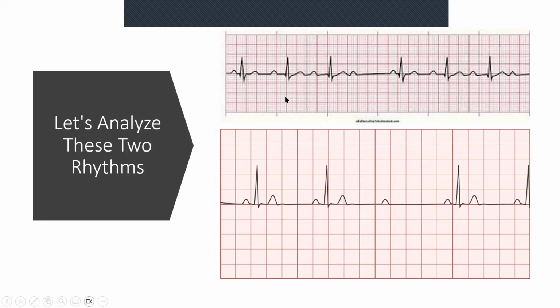If we had to analyze it completely, we've got normal P waves, we've got a PR interval that's getting longer and longer. We have narrow QRS complexes with a missed beat. And then we see the cycle starts again. PR getting longer, and there it's going to miss. So now what's happening? It starts off normal. The conduction is normal.